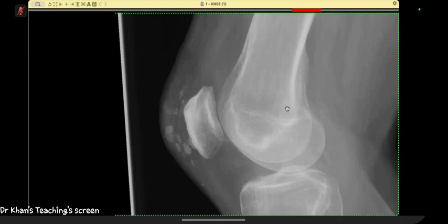Which kind of bursa is here? The prepatellar. So why will there be calcification in bursitis? Sir, if it is long standing and it has variable secretions, it may calcify. If there is a chronic infection and it is long standing, then it may calcify later on.